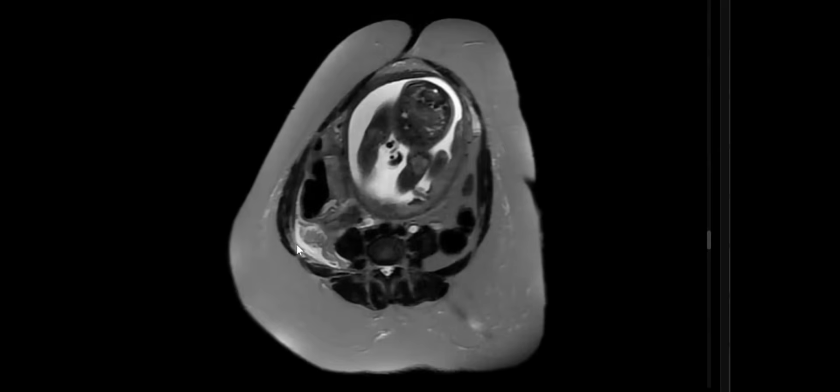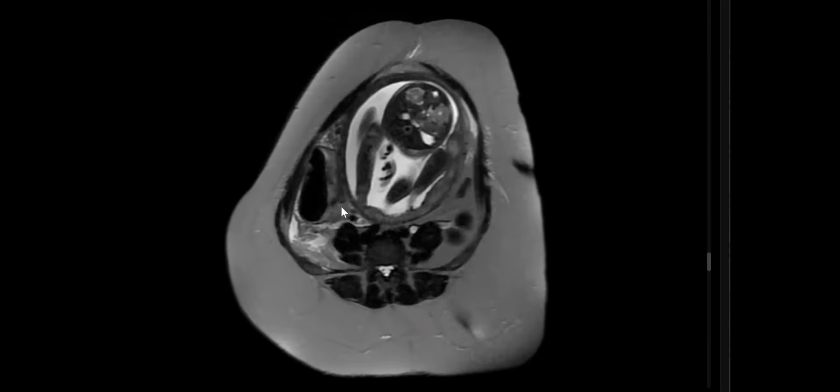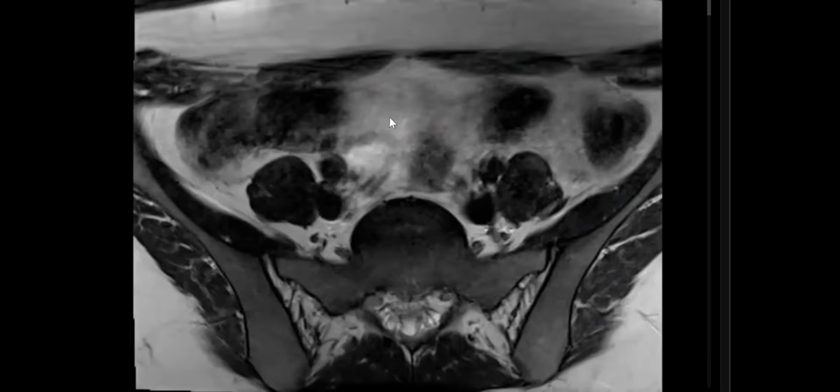No abscess formation, just inflamed fat. And with these inflamed fat planes and fluid anterior to the psoas muscle, I have to look for ovarian vein thrombophlebitis. So again, in a pregnant lady with acute abdomen, look for appendicitis on MRI, pancreatitis on MRI, ovarian pathology, like what? Proceed through this case. Okay.